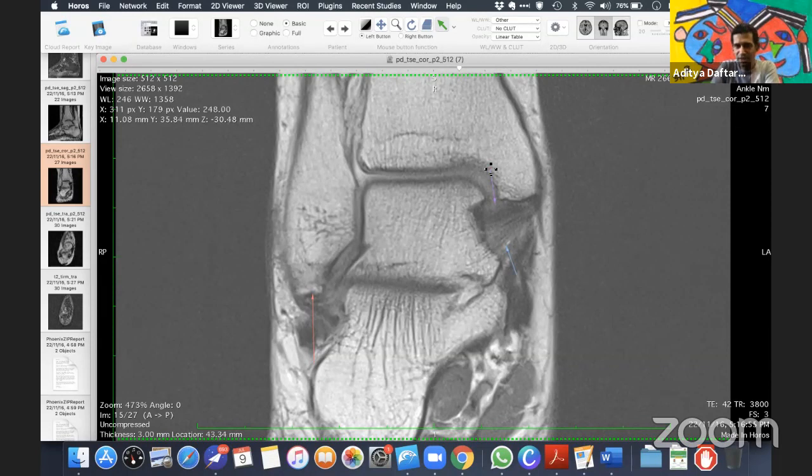So this is a person where you'll need to do some dynamic x-rays to see how much laxity there is. And if they're going to operate on this, there is cartilage, so it's a good case to conserve. Whether you're going to do just a lateral reconstruction or some medial tightening as well is where I would reckon somebody would think about this case.